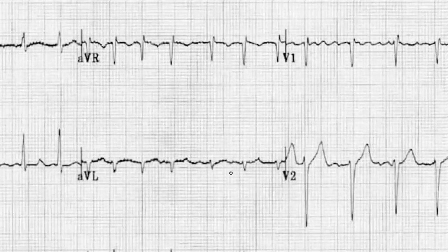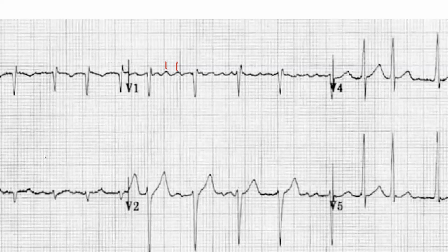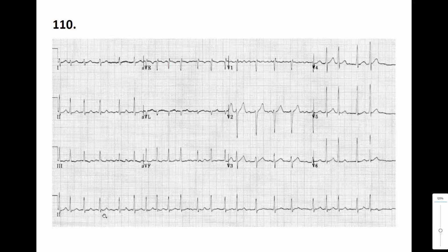Look at V1. Oh boy, look at that one. Again, this is faster than 300, 350. So what do we have here? I'm not sure. Yes, you should.